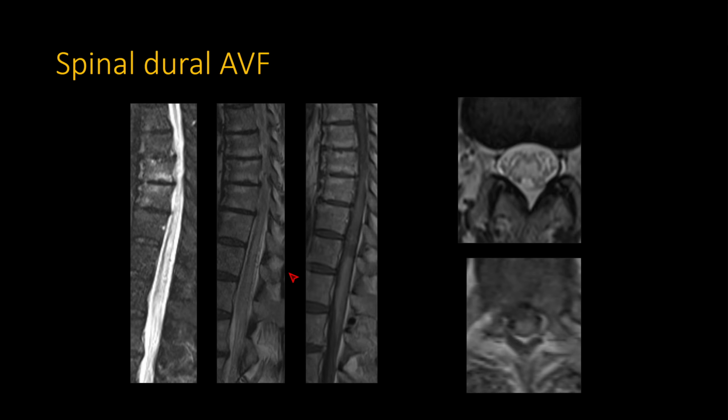I don't think I would prospectively say there are signal voids here, although people have different thresholds on these things. This one would have been a pretty tricky case. But apparently this was a male, in the right age group, and the symptom onset and character also fit. So they went on to get further imaging.